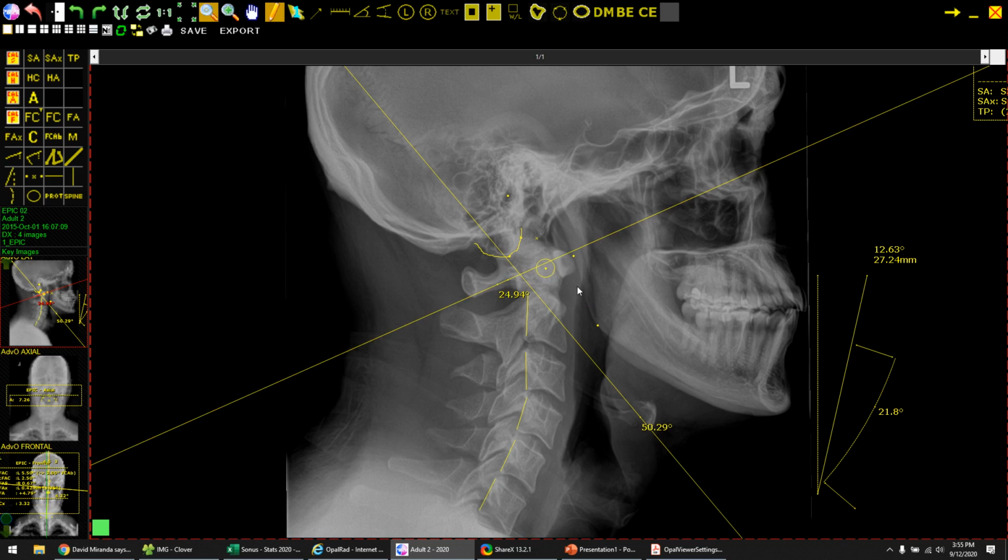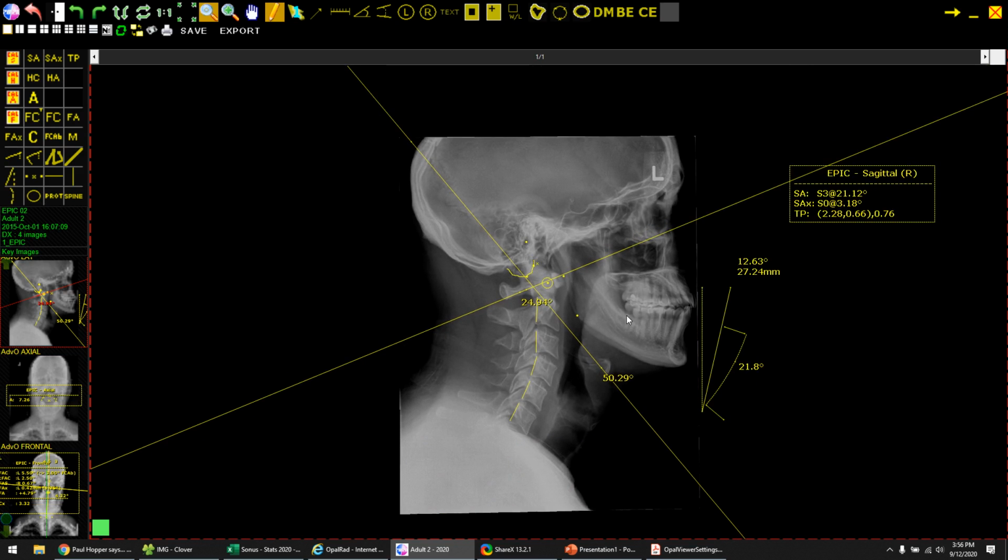So anyways, that's the very, very quick, brief, probably way too much information in just a few minutes, but I just wanted to give you a quick rundown of how we do our X-ray analysis. And by all means, I'm very happy to go ahead and go more in depth with you and explain more of these lines if you need them. I just wasn't sure how much information you did want to know.